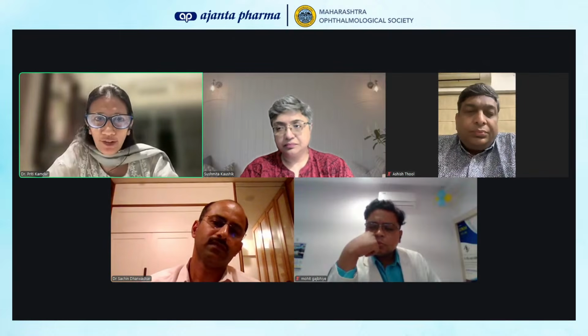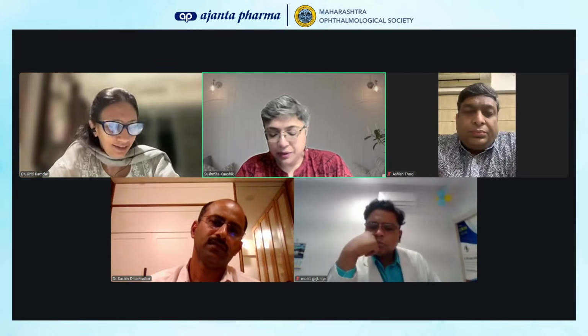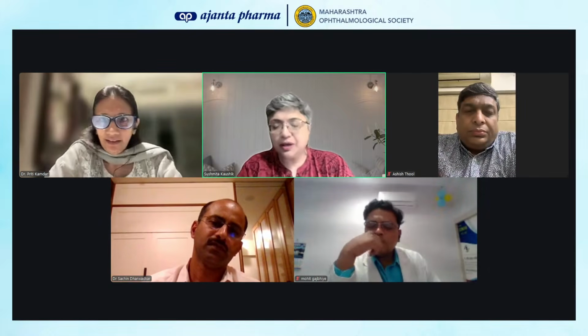Your 2 points on it, Dr. Sushmita? Yeah, most myopes would also have reasonable peripapillary atrophy, and that would affect your segmentation a lot. So for me, I would do the follow-up on fields and take a field as a baseline and assume that the chorioretinal degeneration and everything in a high myope is due to that, and any increase, because otherwise the degenerations of myopia are usually stable.